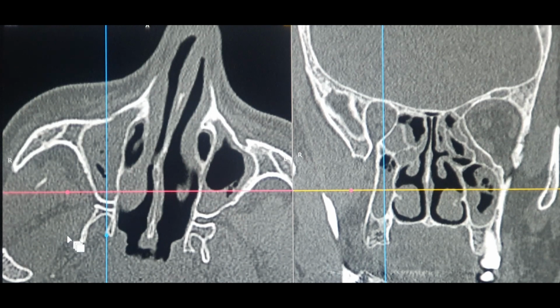It's quite clear on this section as well that this is the proper sphenopalatine canal, and that's the pterygopalatine fossa right there. If you have a JNA over here in the origin at the superior lip of the sphenopalatine foramen, that's going to cause the Holman-Miller sign, which is the forward bending or forward protrusion of the posterior wall of the maxilla right there. That's the Holman-Miller sign, which you can see. I think I've demonstrated the Holman-Miller sign in previous lectures. So that's the normal canal.